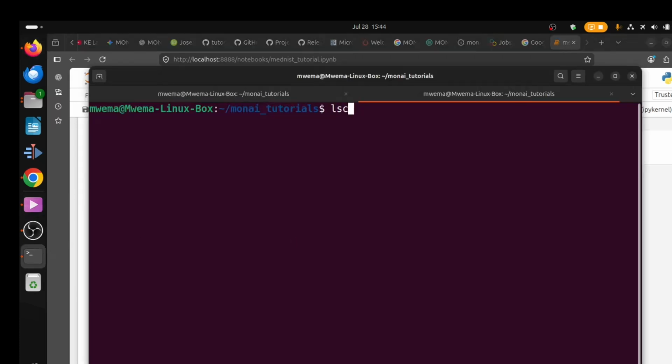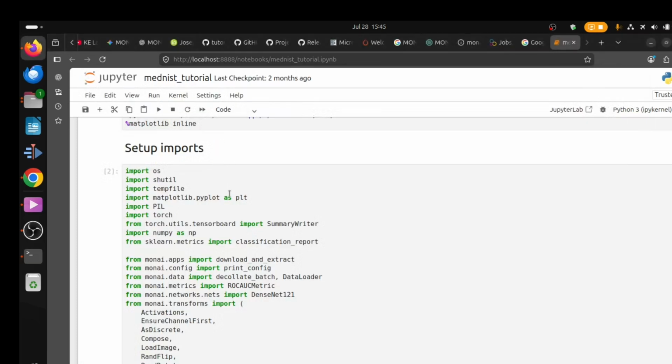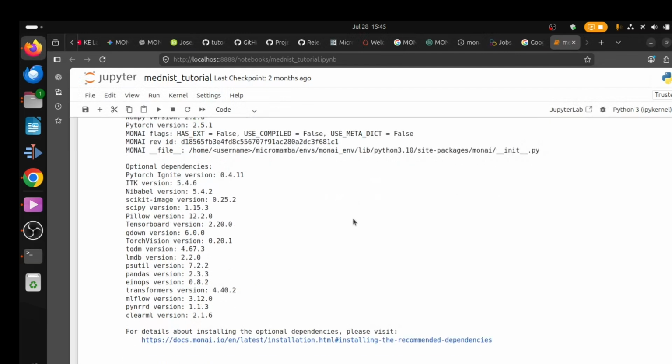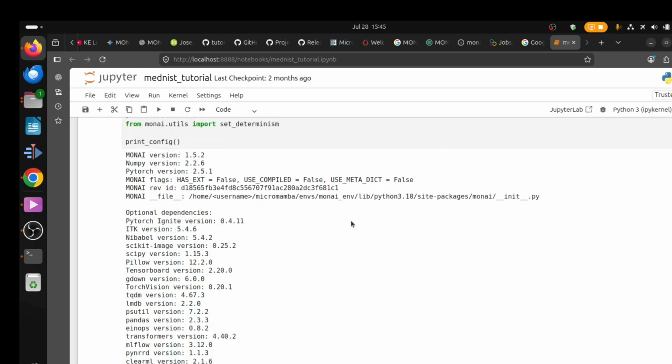For this experiment, I used an Ubuntu Linux laptop with an Intel Core i7 processor and no NVIDIA GPU. I configured the training to run for 2 epochs and used 2 workers for loading the data. At the time, my goal was not to run the longest or most powerful training experiment possible. I wanted to see what I could actually do with the hardware available to me.